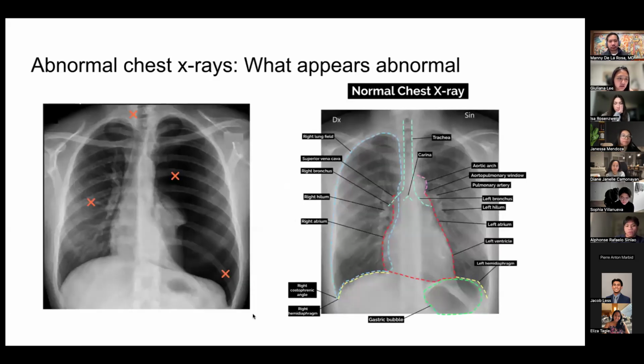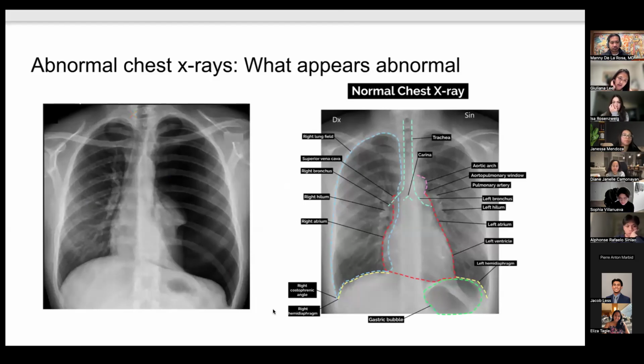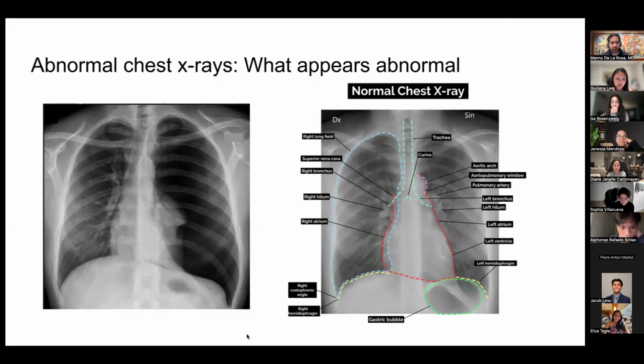Oh, let me clear out this drawing. Alrighty. Check marks, X's, question marks. What is normal? What is abnormal? Go for it.